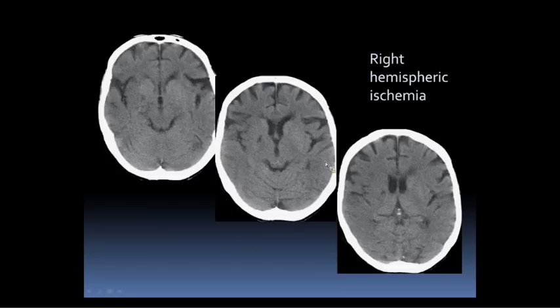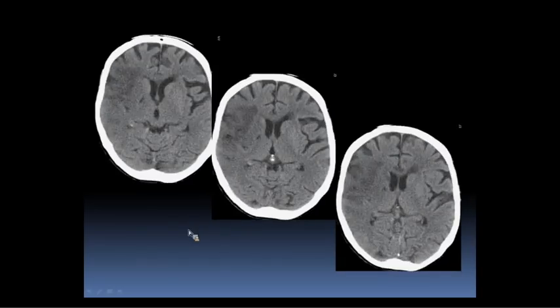So here, not only do you have the insula involved, but you actually have this gray smudgy appearance with some loss of gray-white matter differentiation in the operculum as well. And you compare that to some of the cortical ribbon that's visible on the other side, there's clearly a difference. And then this becomes much more obvious a day or two later, where we see this larger area of hypodensity, not only involving the insula, but also the frontotemporal and parietal opercula.